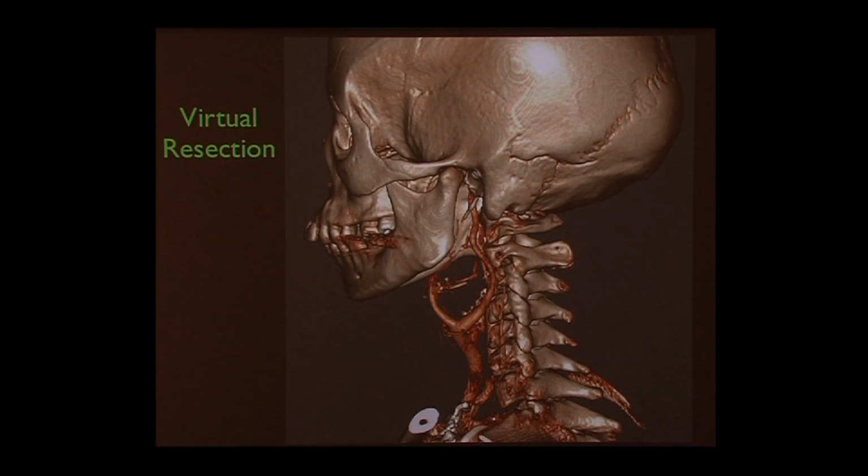And then you can even do a virtual resection. You can practice and take the mass away before the surgeon ever does. Or the surgeon can practice and determine. So here's the carotid artery without the mass around it. And of course, she did have a successful result.